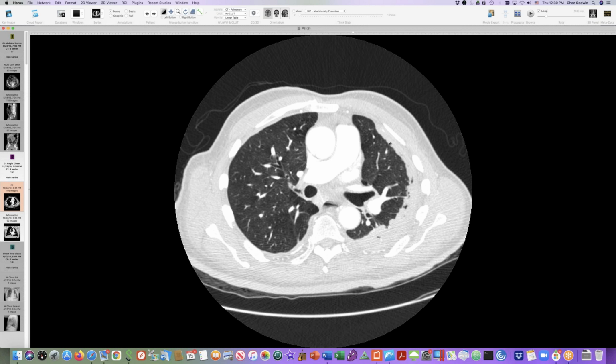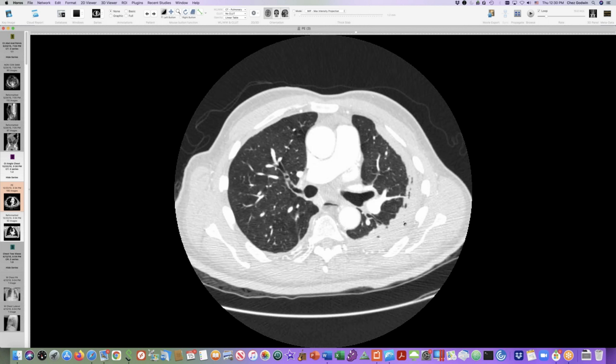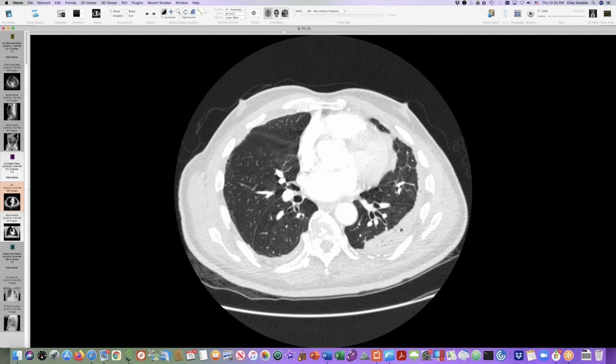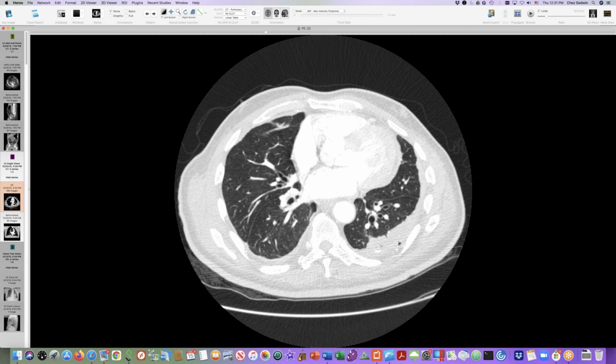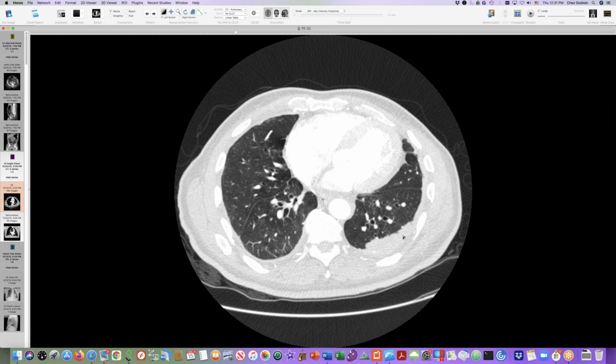Again, we have that periaortic, abdominal, and lower thoracic abnormalities. It's not any less extensive on this later CT. And then here's the rind of abnormal tissue that he had along the left chest wall. So this has been called pleural thickening. It has been called mesothelioma. It has been called lung cancer. The biopsies that were reviewed most authoritatively, most recently, just showed a lot of scar tissue.